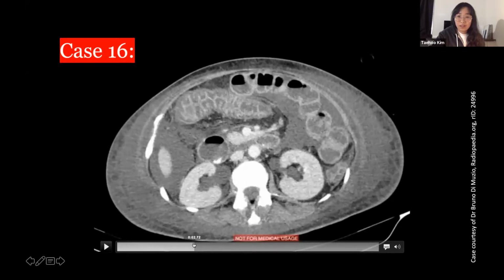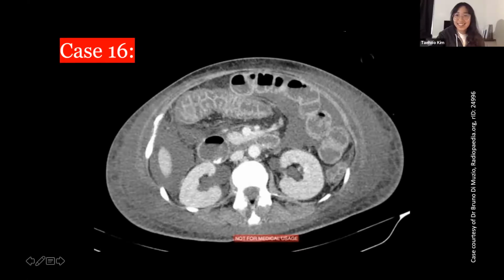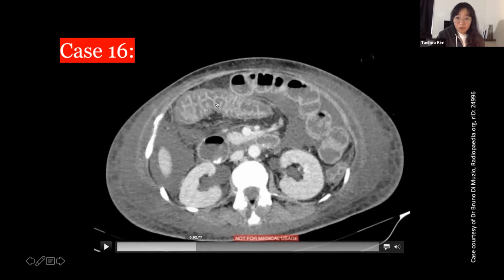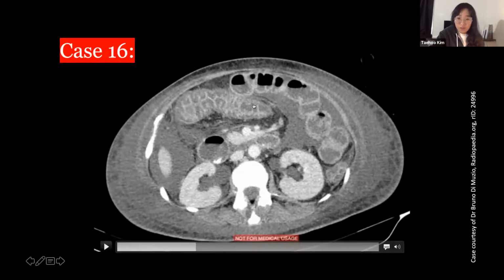It's different than the... what was the other type? Not the Crohn's. Ulcerative colitis. Yes, thank you. The UC, ulcerative colitis. Thanks, guys. That usually doesn't give this enhancing mucosal wall finding. It's just more thickened, dilated, like a sausage type colon. If you remember this pattern, then you'll be able to catch C. diff colitis anytime on CT scan.